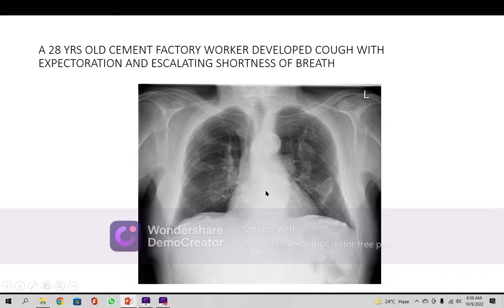Now here you see in this condition that there are, this which I am marking here, fibrotic patches and bands shaped like this, cystic type, you can say, bag-like, something like this. You can see the fibrous bands here. Here there is a marked one. It is a more hyperdense shadow.